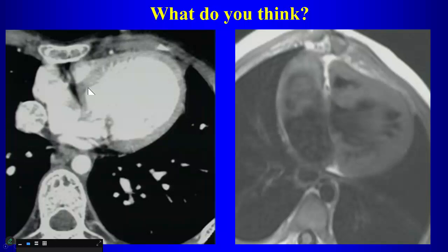And another nice clue is, what is this guy in here? What is this guy? See that guy? What is that guy? That guy right there. What is that?